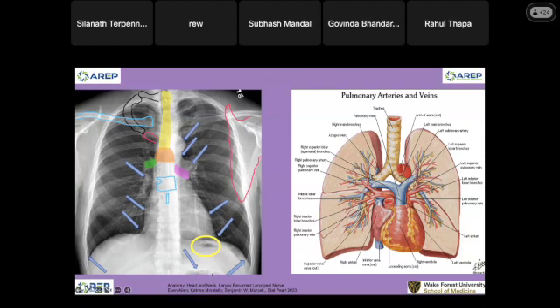And two, you see haustration. Normally, look at this jejunum loop again. They have valvulae conniventes. So the folds here are too different. We don't see the folds. I'm not sure this is the diameter of the colon. The diameter of the colon is bigger here than the jejunum. Number one, the reason why it is colon is the location. I'm talking about a little bump close to the location in the arch of the abdomen, and also we see this little thing here.